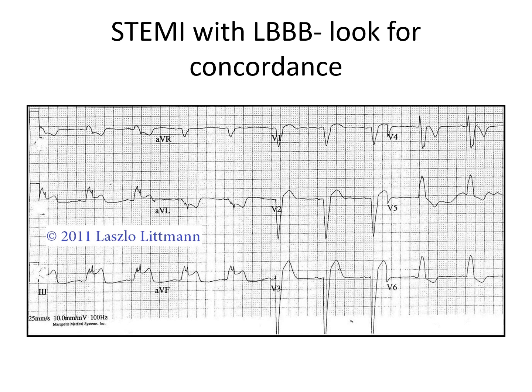So again, it's inappropriately concordant. Finally, look at lead V3. You can see that the J point is quite elevated by about 6 or 7 millimeters, and if you map it out to the height of the QRS, it actually turns out to be more than 20% of the height of the QRS, so it is excessive discordance. Therefore, it's also pathological.